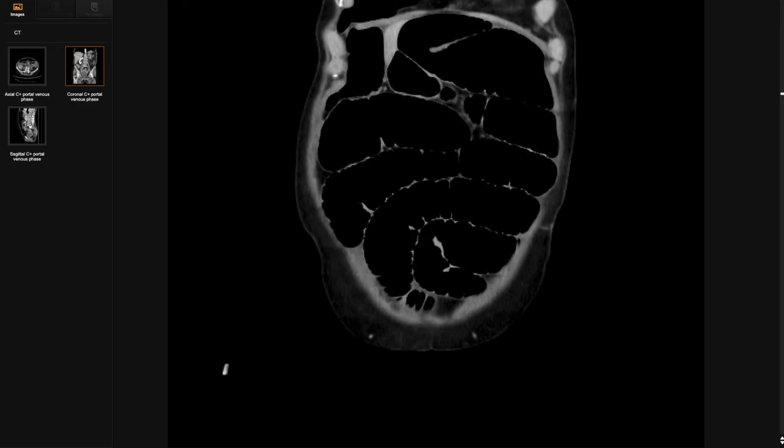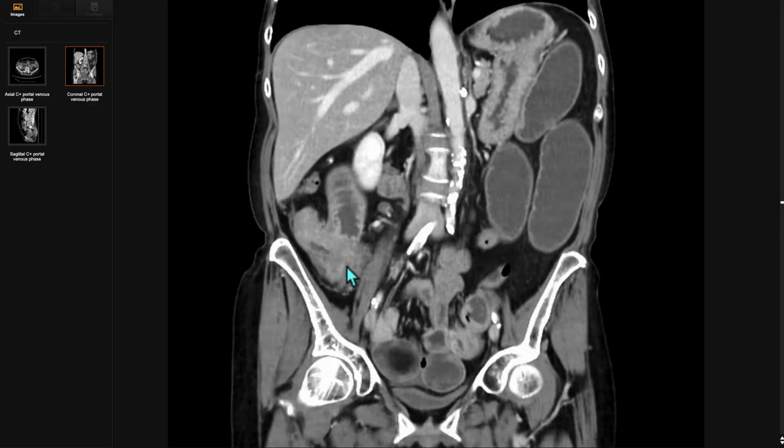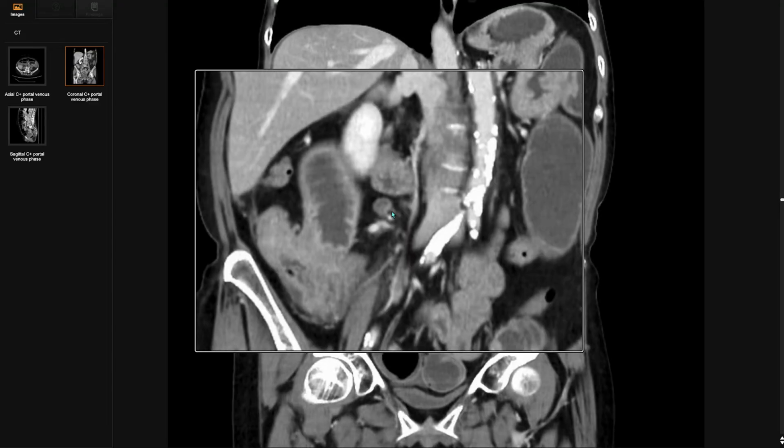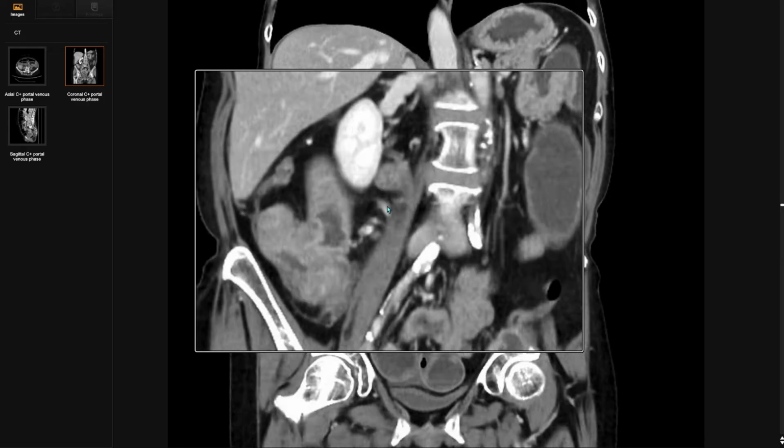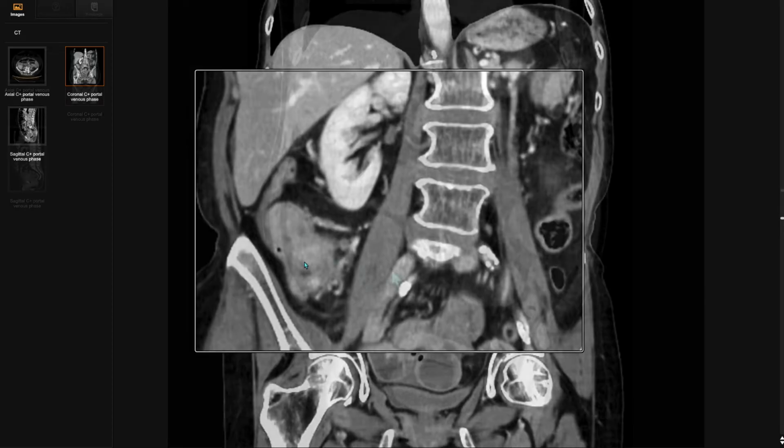This next case presents with a relatively high-grade small bowel obstruction with a transition point in the right lower quadrant here at this irregular ileocecal mass. There are also some mildly enlarged and slightly irregular-looking ileocolic lymph nodes. This is a relatively typical appearance of an ileocecal adenocarcinoma.